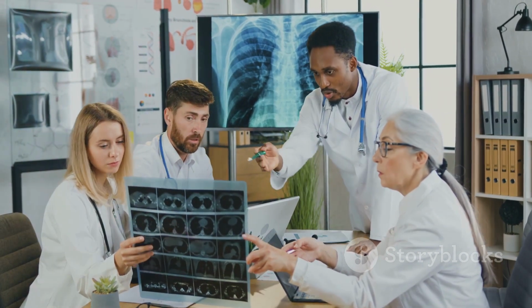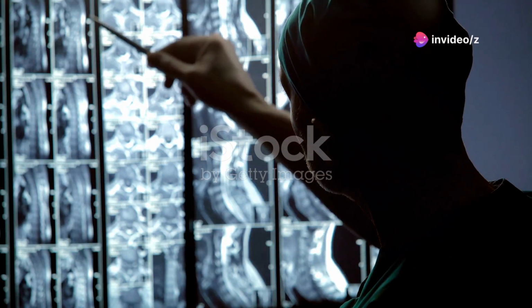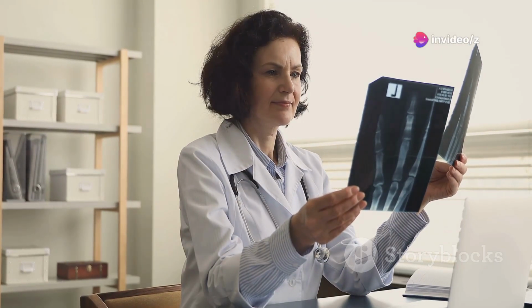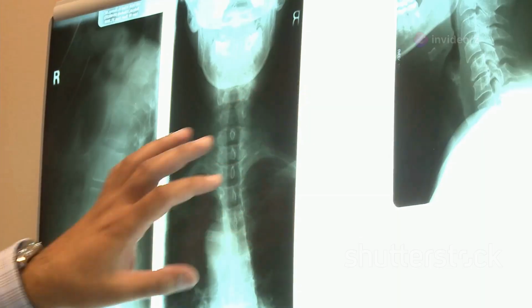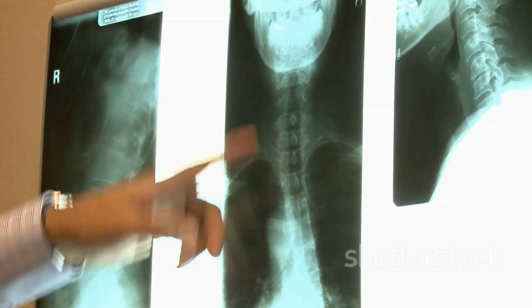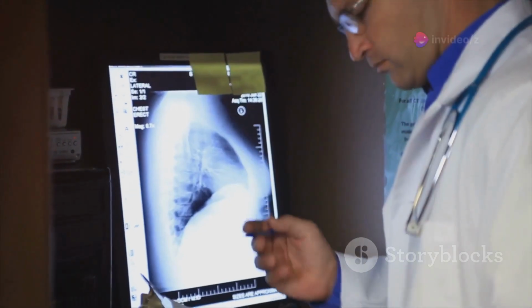In the world of medical imaging, two heads are often better than one, and two views are certainly better than one. When it comes to MSK X-rays, obtaining multiple views is crucial for accurate interpretation. Why? Because a single view provides a limited perspective, like looking at a sculpture from only one angle. Think of it this way.